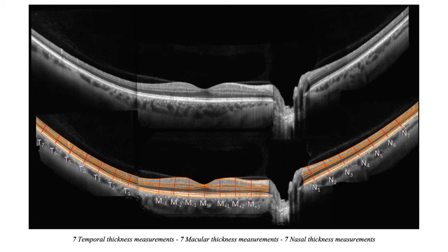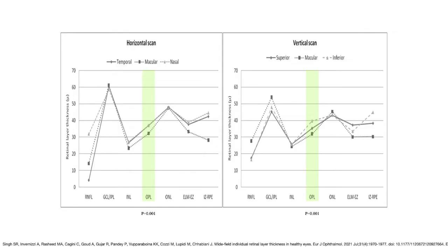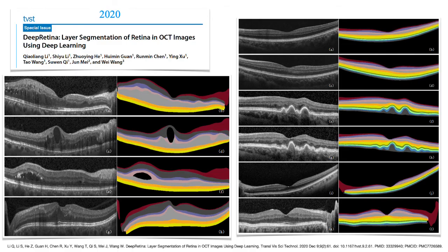It was performed using the 55 degrees Spectralis lens, not just centrally at the fovea but also temporal, nasal, superior, and inferior. Again, we found a sort of difference in thickness based on where we obtained the measurement, if it was macular, inferior, superior, or, on the horizontal scale, macular, nasal, or temporal. So the outer plexiform layer changed also in the periphery based on where we obtained the measurements.